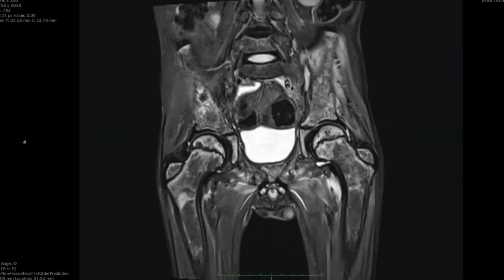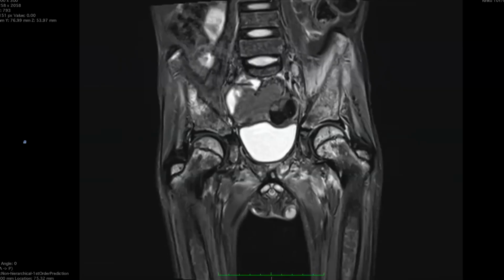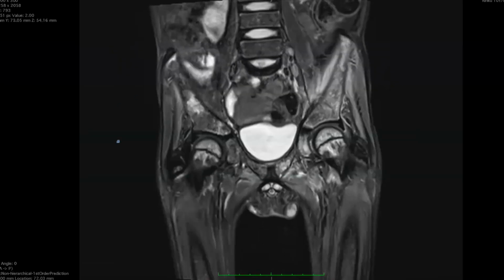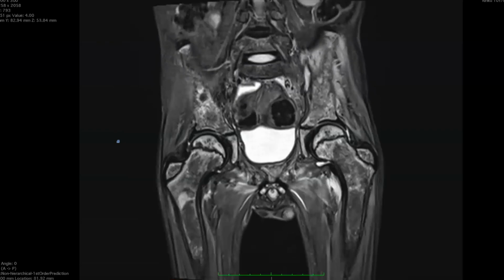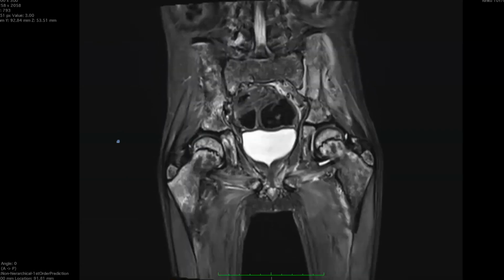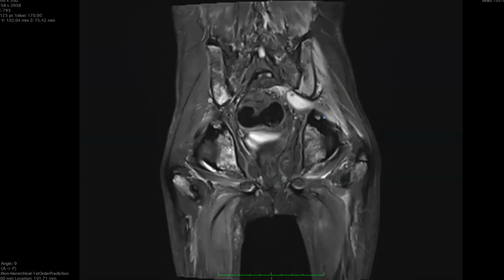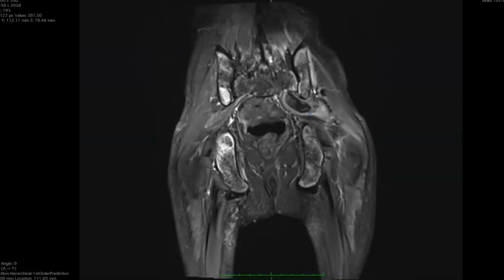So you said that there is diffuse infiltration of the marrow, predominantly involving the pelvic bones and femora, and this is likely a diffuse infiltrative disease. One more thing, you also mentioned that there is some hyperintensity in the left-sided muscles as well, including the iliopsoas muscle, left-sided glutei, and there was one more finding here.